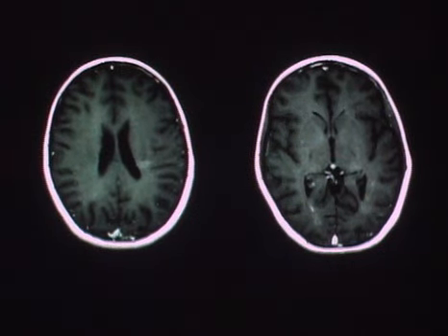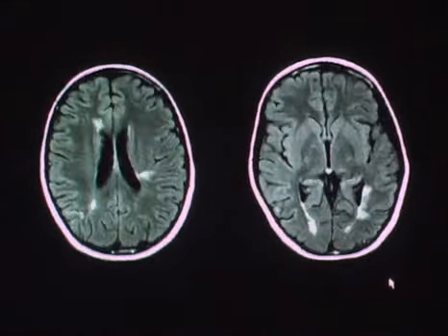And so here's an example of ADEM in one patient where we've got some very faint enhancement identified within white matter along the left corona radiata, also seen in a periventricular distribution, seen more posteriorly. When we take a look at the FLAIR-weighted imaging, we see a number of white matter signal abnormalities. In another patient, this could easily be multiple sclerosis, but in this patient, it turned out to be acute disseminated encephalomyelitis.